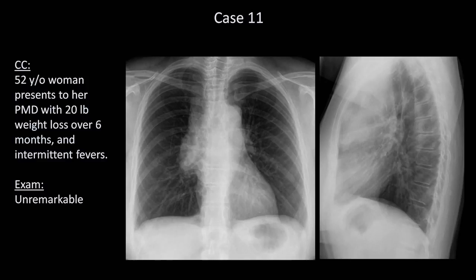In this X-ray, there is a large mid-thoracic mass that appears just to the right of midline. Where exactly is that mass? The clue is actually on the lateral film. Look here. What's not present? There should be a retrosternal lucency, which isn't there, suggesting something occupying the anterior mediastinum. So this mass that looks like from the PA film to be to the right of the mediastinum is actually probably arising from within the anterior mediastinum and spreading laterally.